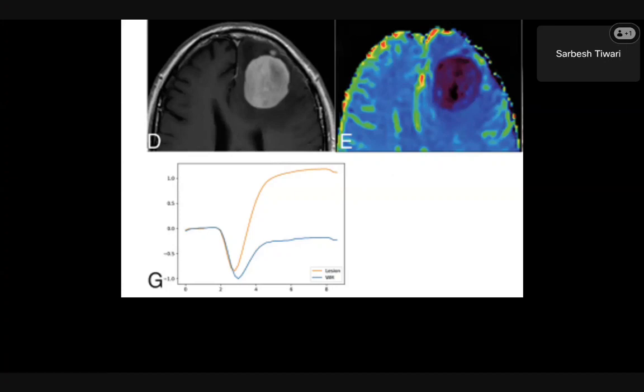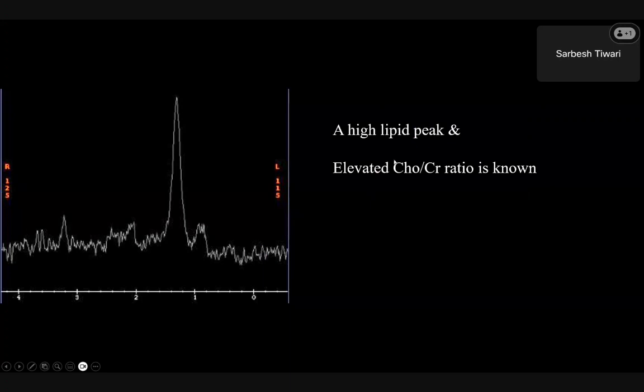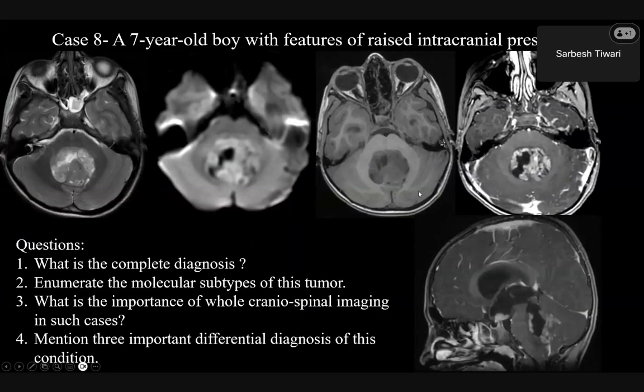So you have this T1 image. This is a post-contrast image. Group 3 medulloblastoma. Karan, I'm impressed. Harshit, I'm impressed. But still, your diagnosis is incomplete. Intraventricular medulloblastoma. Medulloblastomas are invariably intraventricular. I mean, group 3 and group 4 are intraventricular. With hydrocephalus, so I'll give you half a mark extra, Kamlesh, but you still have to get some more marks. Medulloblastoma with hydrocephalus. Ependymal spread.